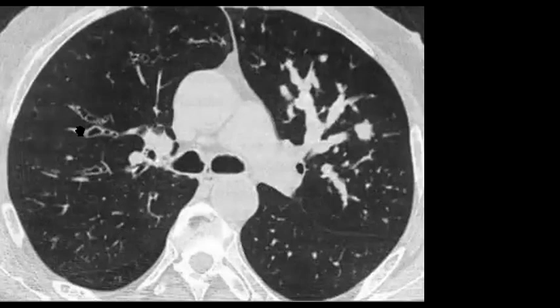And always you should describe, to not miss any marks, the type of bronchiectasis. So there is bronchiectasis, right? And it's better to mention it is a central bronchiectasis and which lobe is predominantly affected.